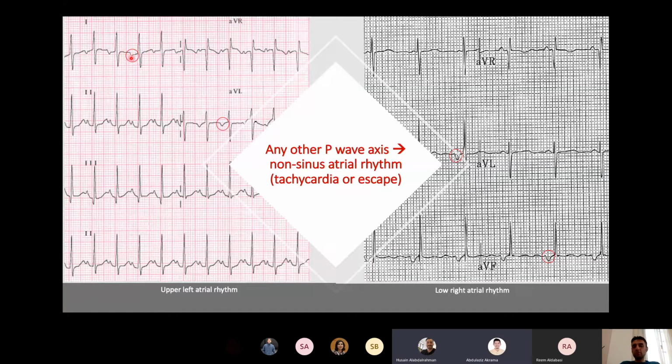Okay. So these are all our patients. This patient is roughly an infant, around 8 months old, with left atrial tachycardia. Left because the P wave in lead 1 is negative, so you're going away from the left side. So there's something coming from the left side and traveling away from it. This patient had incessant atrial tachycardia, difficult to treat, a complex patient. But anyway, this is a narrow complex tachycardia, more specifically called atrial tachycardia, and accordingly she was treated. But anyway, this is another example of non-sinus rhythm.